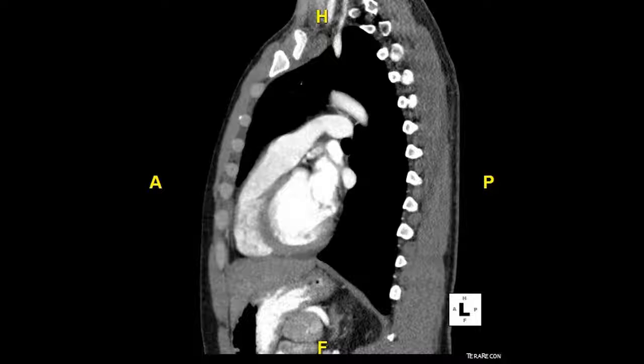At first, we had cut through only the left pulmonary artery, but now we've moved medial enough to have cut through the pulmonary trunk, which is connected to the right ventricle. And I'll draw that out roughly for you right here in green. We can also see a new structure coming into view superior to the pulmonary trunk, and I'll point that out in blue right here.